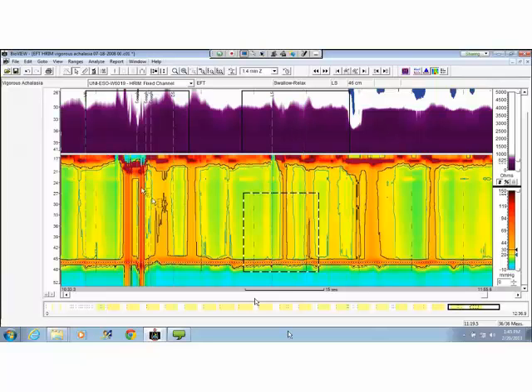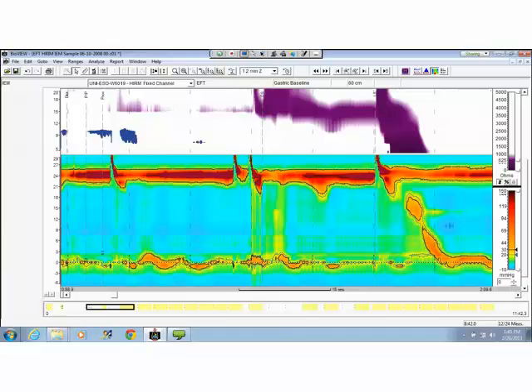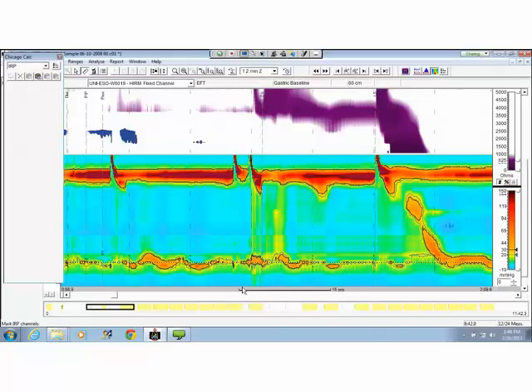I have one more I wanted to show you as we're talking about somewhat unusual swallows. This swallow right here, if I were to measure a peristaltic break on that swallow, there is no peristaltic break. Even though visually there appears to be a break in the 20 millimeter isobaric contour, this blue tracing around the striated muscle comes down lower than the blue 20 millimeter isobaric contour line for the smooth muscle. So there's no gap. It's not like the striated muscle stopped here and then the smooth muscle started later on. There's really no break there to measure.